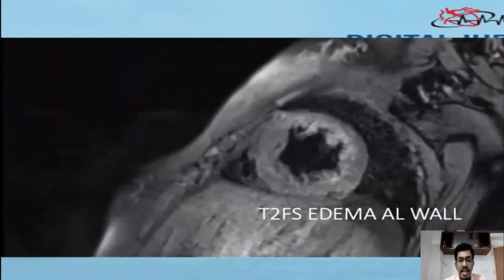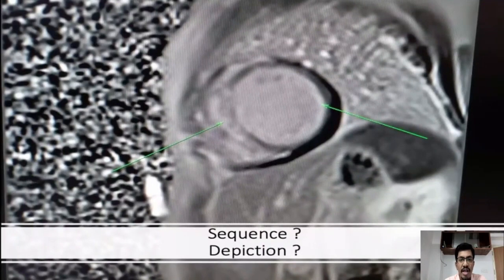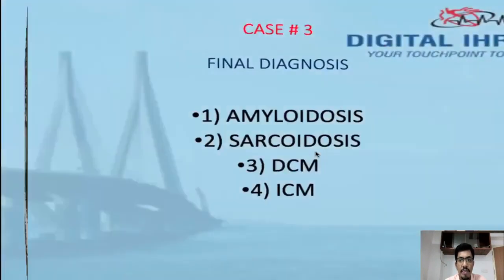When we did the T2 images, we found that there was a significant hyperintense area in the T2 map, suggesting that there is myocardial edema. And the post-gadolinium images again showed a mid-myocardial septal delayed enhancement. The arrow shows it, and also a subendocardial lateral wall enhancement post-gadolinium. And this is again very clear in the three-chamber view, the septal delayed and the lateral wall delayed enhancement.